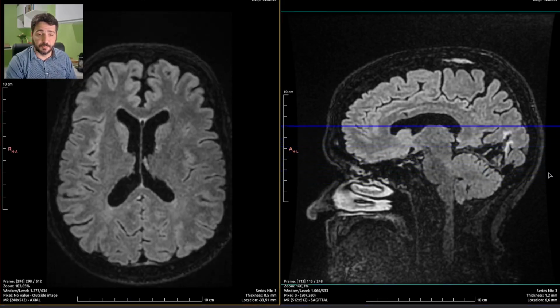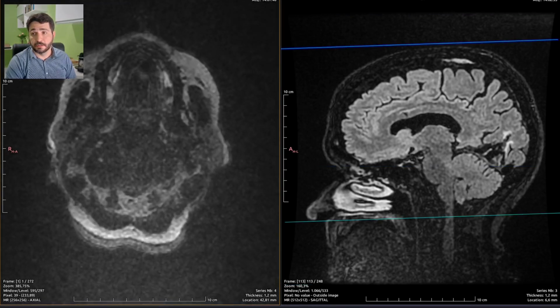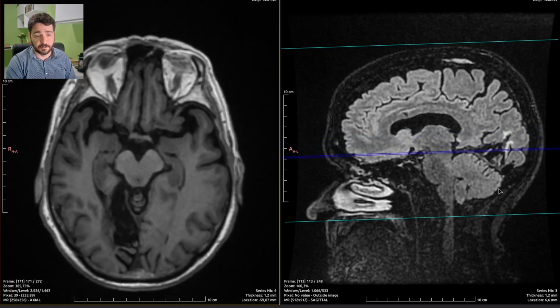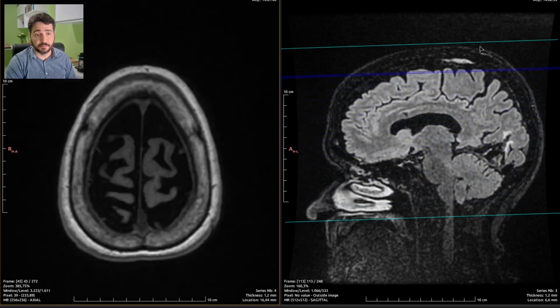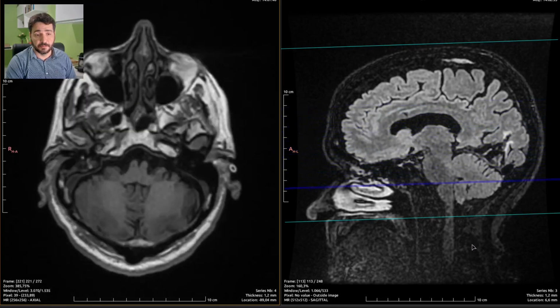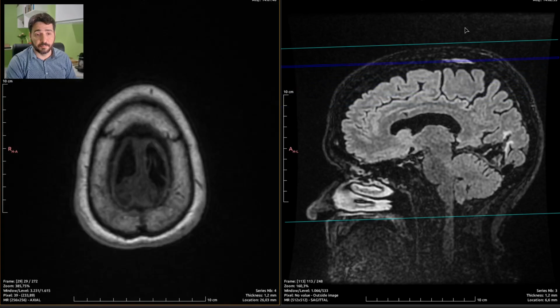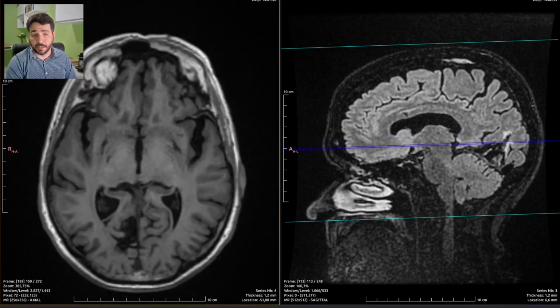in the occipital lobe on the right, and they had also an axial 3D T1 acquisition, which makes no sense, but they did it. So this should have been also a sagittal acquisition to save time. I believe this place has a really new MRI scanner, and they should make a lot of money out of it, because they surely don't care about exam duration.